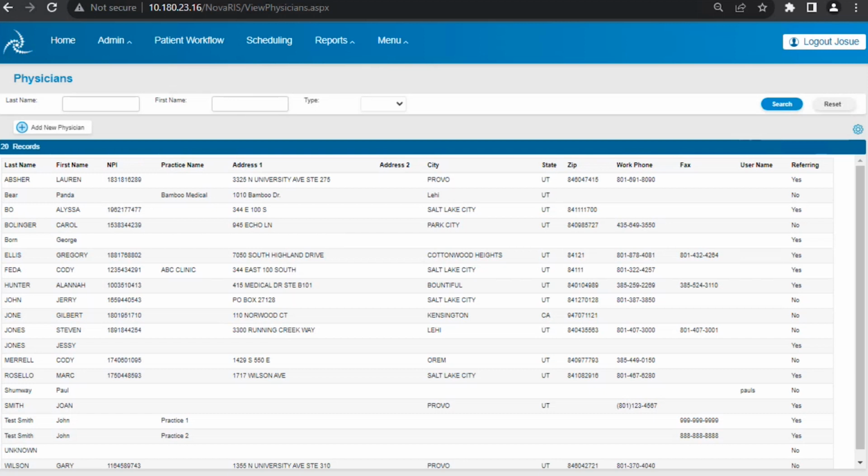And when you click that link, it will open that alert view app and it will let you see that report. And the other is that we can also send you an SMS message. So in that case, we will send you an SMS with that link, and it will still work the same. When they click on that link, it will open the browser and it will let them see that report. But we do not have it directly with the WhatsApp application.